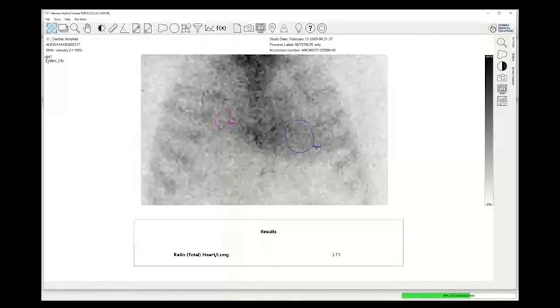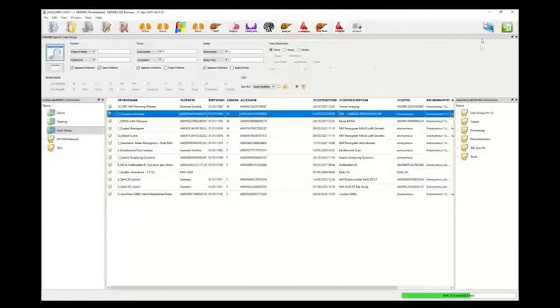So just finally, in terms of the user interface, another aside feature that this does demonstrate is you'll see here that you've now got the option to show the energy window, so that's quite useful, obviously in hybrid viewer displays, to have that option activated in the overlay.